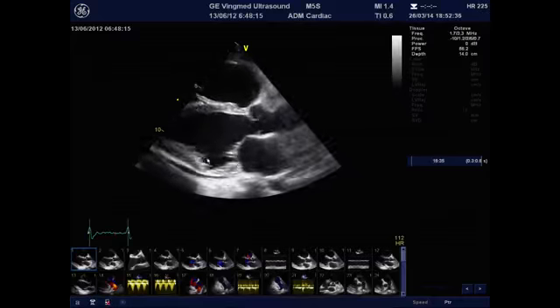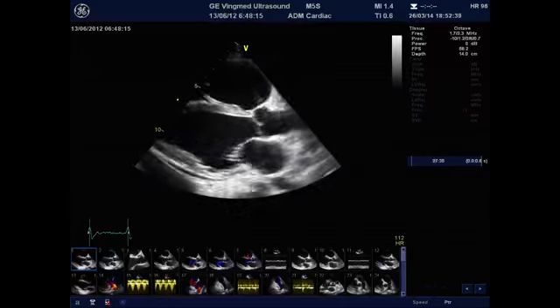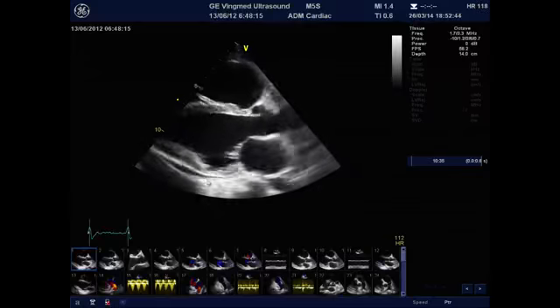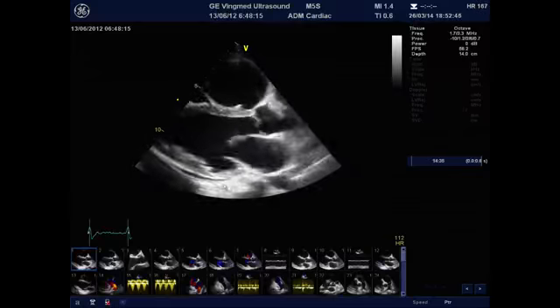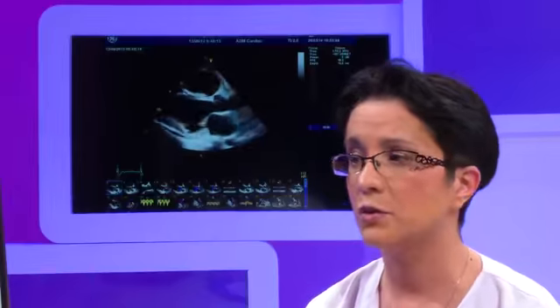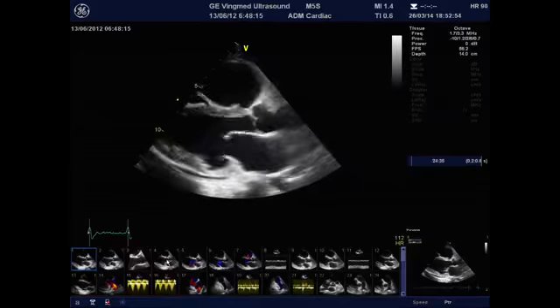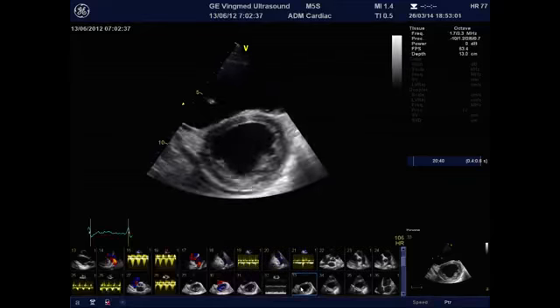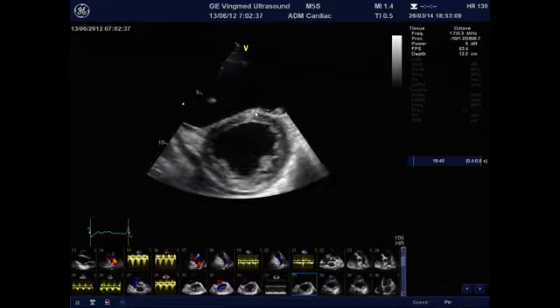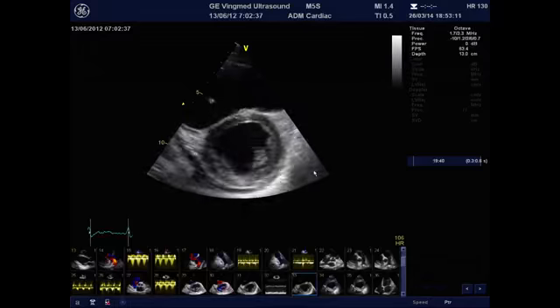Here we can even see a region of some hyperechogenicity, which may make us think that there is also a coronary artery involvement. Again, pericardial effusion, characteristic to connective tissue diseases as an association. When we go to a short axis, we see again the global left ventricular dysfunction, with some flattening of the interventricular septum only in diastole, indicating the possibility of right ventricular volume overload this time.